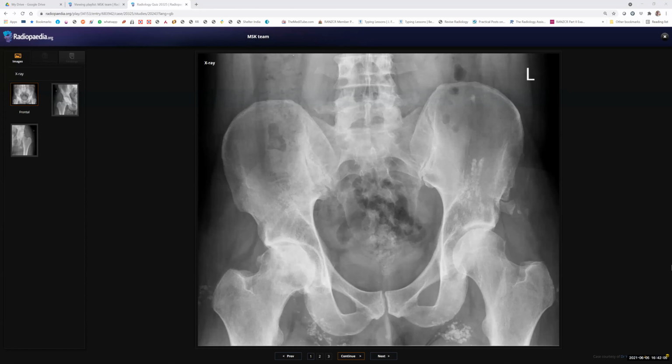What are those? The calcinosis. So this is soft tissue calcinosis or dermatomyositis. Will the patient take steroids for that? Yeah, the patient may be taking.